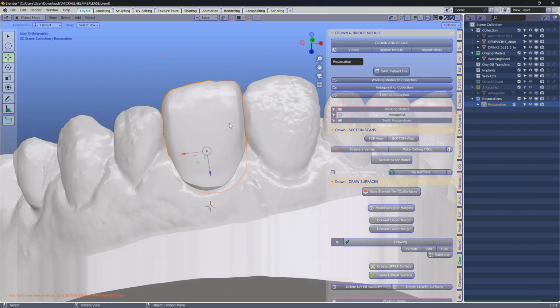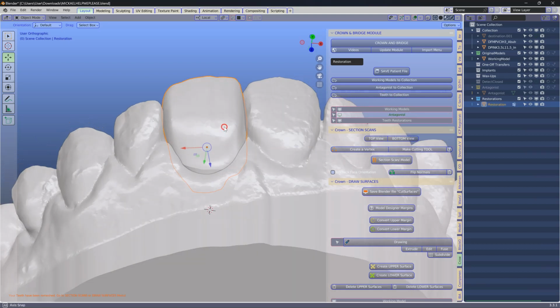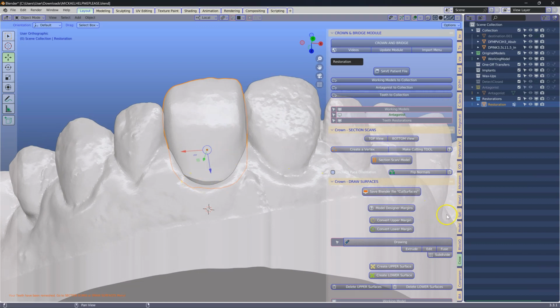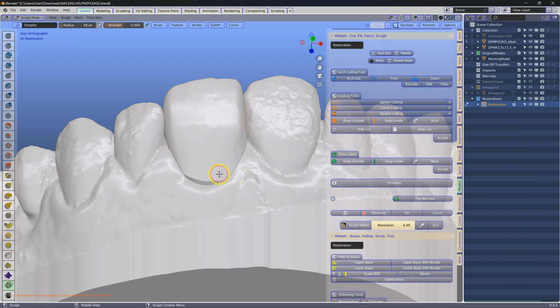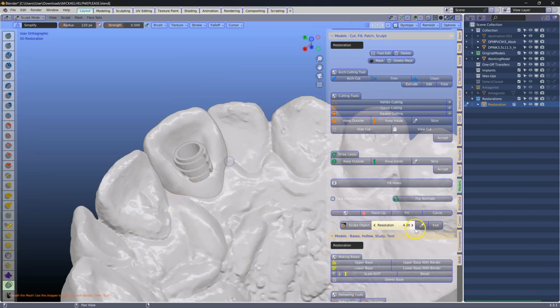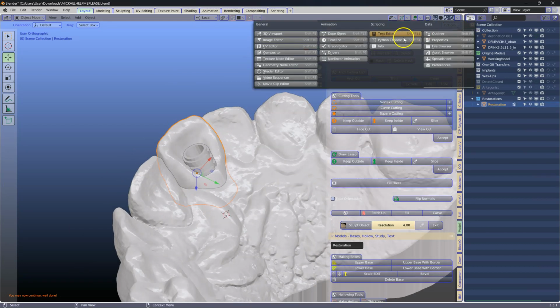Now let us cut this tooth because this has been socketed nicely, and we want to sort of mimic that as well. So before I do that, I'll just quickly go to the model designer and I'll just sculpt this down a little bit to go with the rest of the tooth shape. So something like that. Now I'm going to use Blender Boolean.